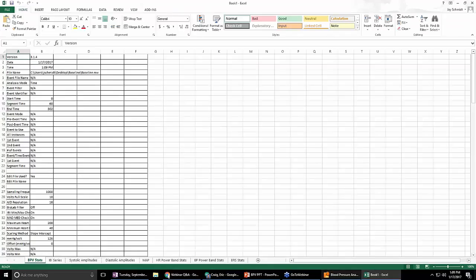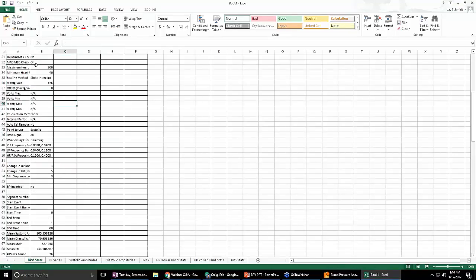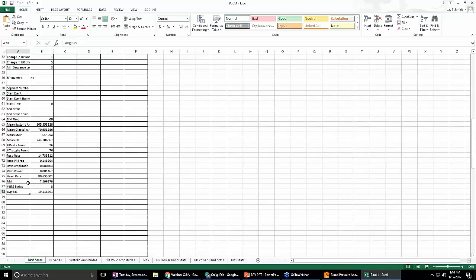And you can see here it's filled in all of our statistical information. So just the time, the versions of everything I use, the sampling frequency, pretty much everything you might need to report all these data, the Hamming function, the frequency bands, everything that we used. And then finally, all of that statistical information that we saw here on the right is found here.